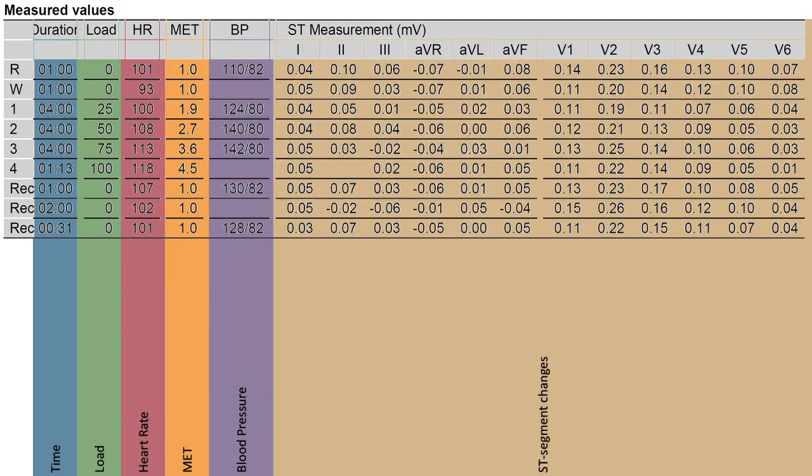And now it's really easy to identify if there are any significant ST segment elevation values, because remember, an elevation of more than 0.2 has clinical importance. If there's a minus, it means ST segment depression. As you can see, V2 does have ST segment elevation that has clinical importance. So yes, we can determine if there's injury to the heart here.